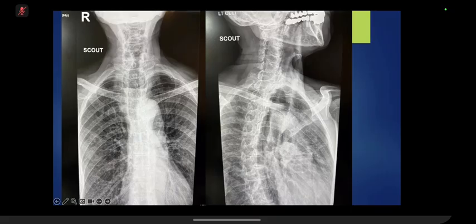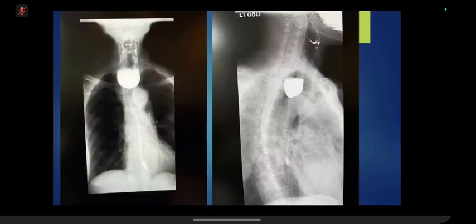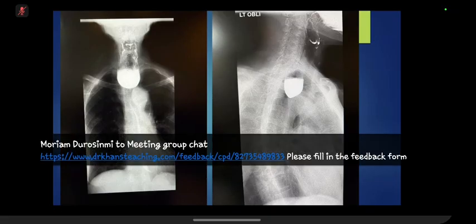Okay, so the patient presented with dysphagia. What are you going to do next? Next, barium swallow, or contrast swallow, yes. So there is a large contrast-filled pouch seen in the proximal thoracic inlet. I could not see any passage of contrast beyond this, so I would like to see the other images of the study to see if the contrast passes or not.